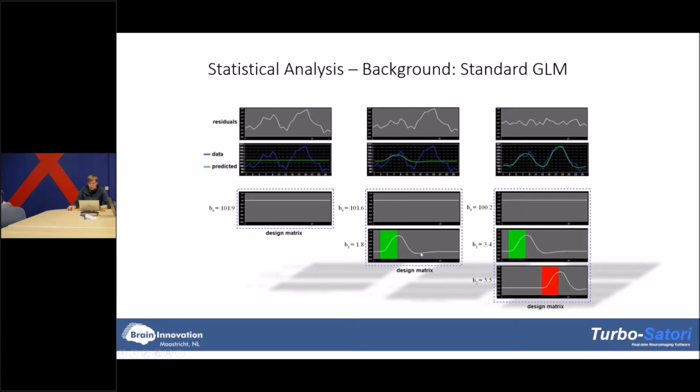If you provide the information of one task, we will get explained data for this one task, but not for the other. And if you add another task, we would predict the two time courses and could also see differences. This design matrix is created automatically based on the triggers, but you can also provide protocol information if you don't have the triggers at hand.